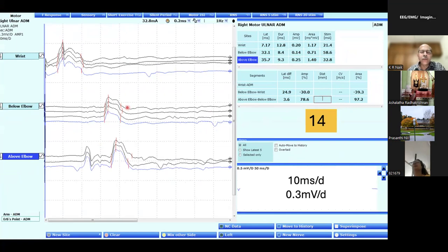But when that stimulus was given, this median volume conducted impulse came, with the median nerve also stimulated at the same time because of the spread of stimulus. So this CMAP from the median nerve innervated muscle fibers came in, that sometimes will give a negative interval, because sometimes the cursor may automatically go to this trace and give a very wrong value.